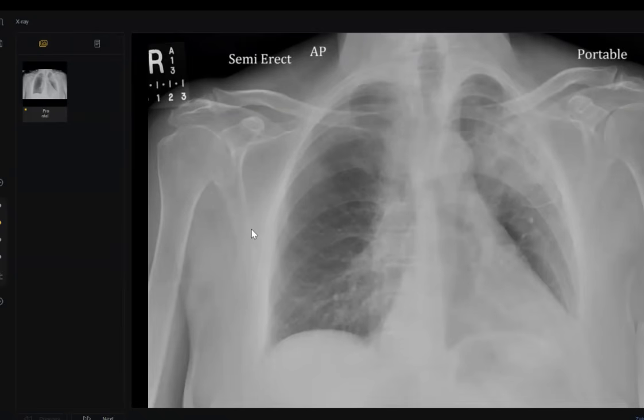So I would recommend contrast. One second, doctor, where is the rib destruction? Okay, which rib first, and which second, third? Second rib anteriorly, the part of... Okay, third maybe. Part of the third rib.